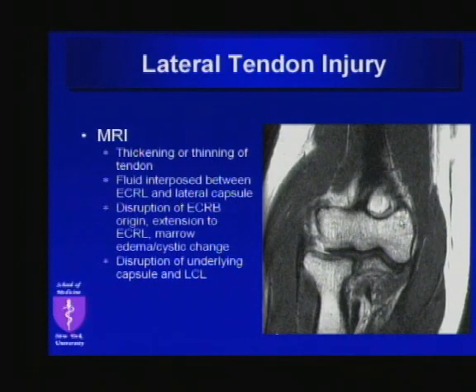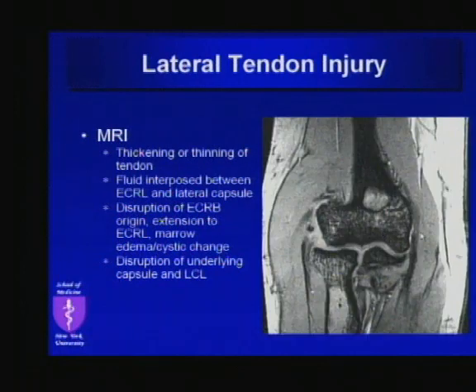This last case also depicts an interesting imaging finding, which you can see sometimes on plain film. If you look at the lateral margin of the joint here, you're going to note this small area of focal signal abnormality, and the signal intensity there is similar to the adjacent marrow, okay? So if we do a gradient recalled image, we see a little bit of blooming in that area.